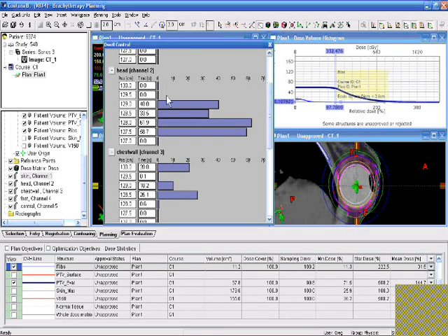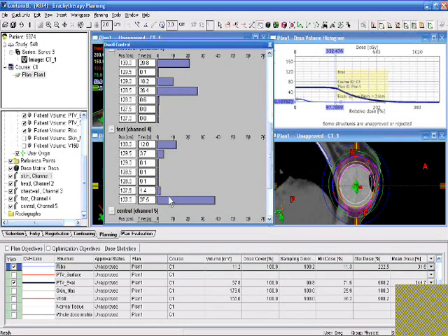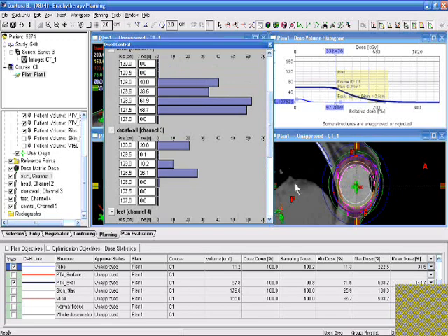The reason that this gets more dwell time than the one toward the feet, if you look at the one toward the feet here, it's got some dwell time at either end, but mostly not, and the total here is quite small. Now the reason that happens is that we're trying to optimize the volumes. Remember that all this optimization is based on the DVH.